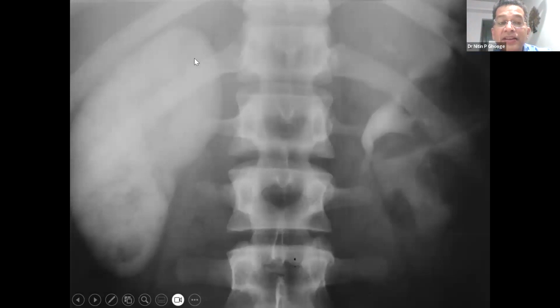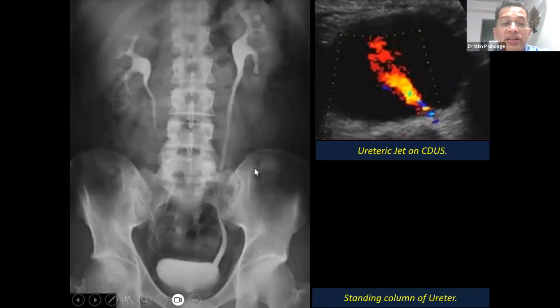And this is a dense nephrogram. This is a persistent dense nephrogram because of the distal obstruction on the right side. Whenever there is contrast in the ureter, it should be seen in some segments, then no opacification. So peristalsis leads to non-continuous opacification of the ureter. But if you see something like this, a continuous column is a sign of some obstruction at the VU junction.